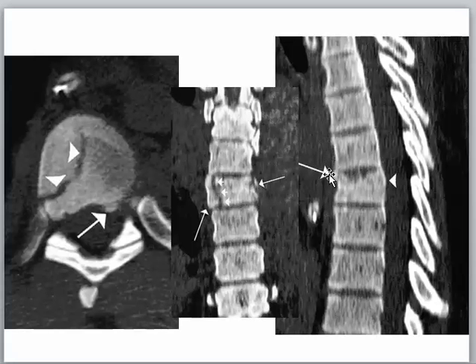And here we get the compression of the vertebral body with anterior bulge, which could be a hematoma again. This can increase the size of the prevertebral soft tissue if there is a hematoma. And here there is a slight bulge of the vertebral body into the spinal canal, interrupting the middle column. The middle column is containing the cerebrospinal fluid and the cord. If there is bulge, that means there is compression.